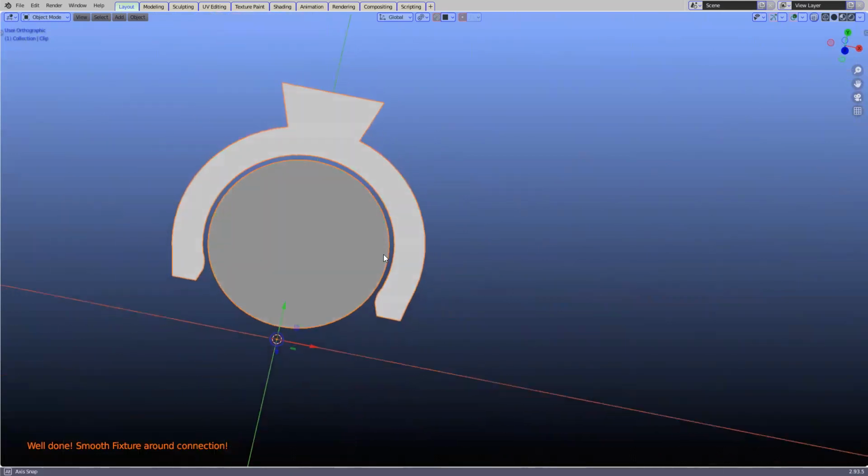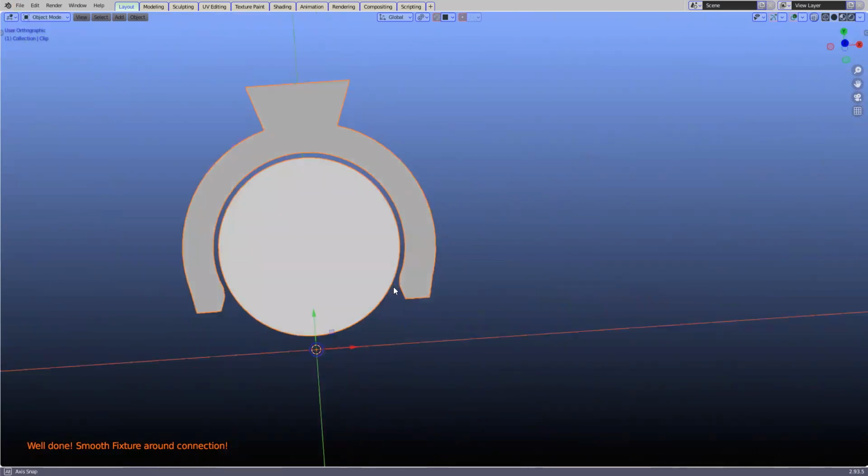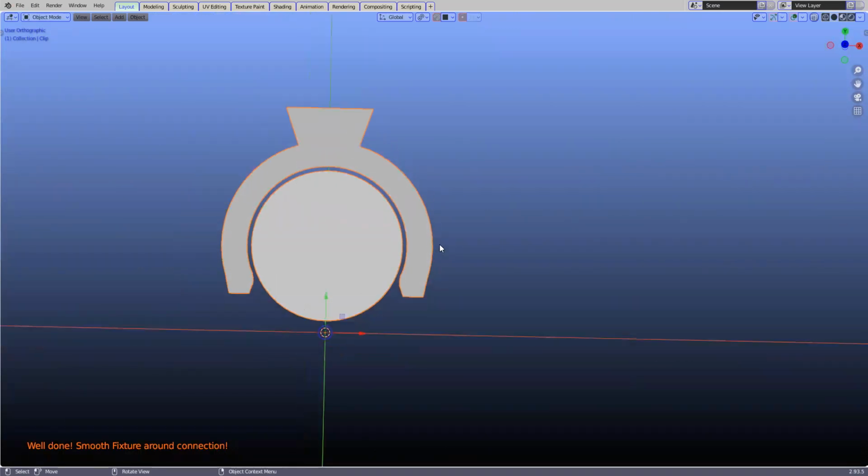Now, how does this tie in with the bar module? I'm going to get into this now. You can imagine that you could have any shape with a layer over the top of it so that it can easily be made into a superstructure.